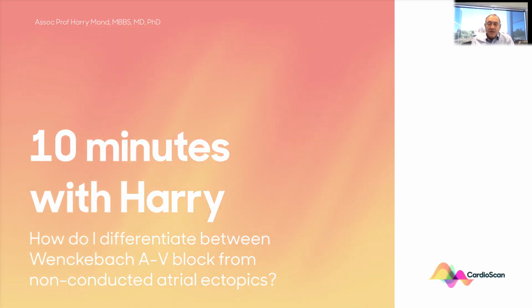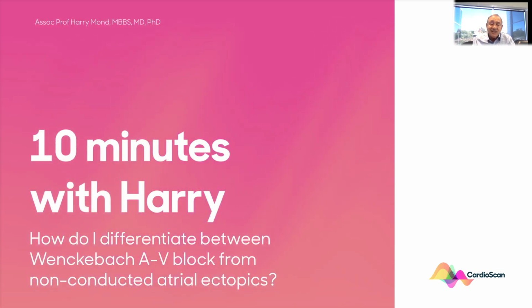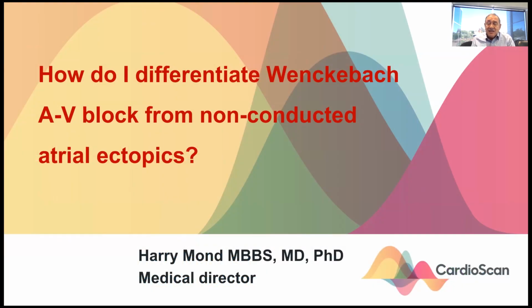The most common error I find with Holter monitoring with technicians is that they have great difficulty differentiating Wenckebach AV block from non-conducted atrial ectopics. Actually, it's quite simple in the vast majority of cases to be able to differentiate it, but nevertheless, difficulties come because the eye does not pick up the differences between the two.